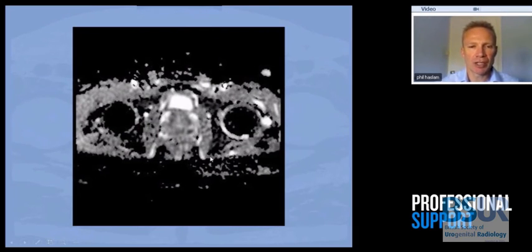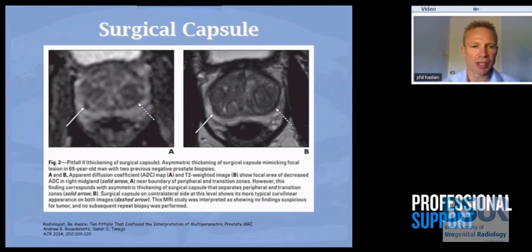Now, you'll notice this scan doesn't actually look that good resolution-wise, but I think when you're doing the diffusion-weighted imaging, it's much more important to get the signal and high signal-to-noise ratio than a high-resolution scan, because your resolution is going to come from your T2-weighted scan. That's your high res, and as long as you can correlate the two with equal slices, you ought to be able to locate your tumour quite well. So the resolution is not as important on the ADC and the diffusion weighted imaging. But nevertheless, this is actually an extremely low resolution scan, and normally we would have higher resolution than that. It's not really time to go into the technicalities of exactly what matrices and things we use for this.